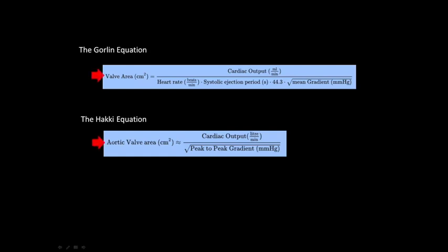And so what we do is we can get the valve area measurement from planimetry. We can get the cardiac output from the multi-phase data, measuring the left ventricular endocardial contours in all cardiac phases. And then from that, we can calculate a gradient across the valve. One limitation I should mention is that these equations work provided there isn't substantial mitral regurgitation or a ventricular septal defect that would artificially elevate the left ventricular stroke volume.